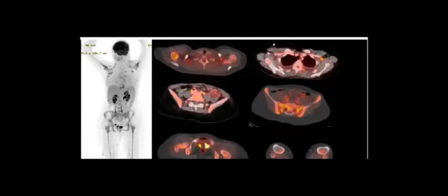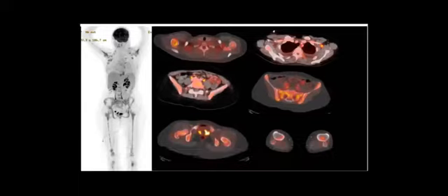Very nice. Okay. Then I will show you this case, and we still have time. Okay, we still have time to go to the convention again. Okay, what do you think about this? How to describe? A 16 years old female patient. They already have a primary, and they did a staging. Try to describe. I think the most helpful here will be the MIP.